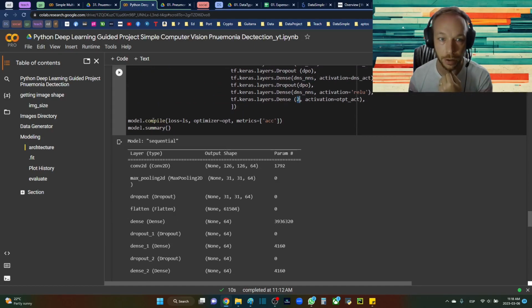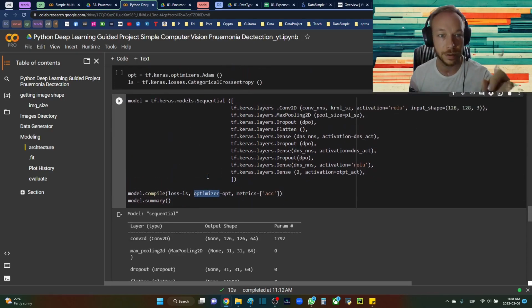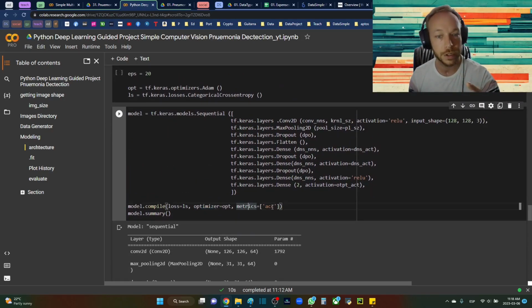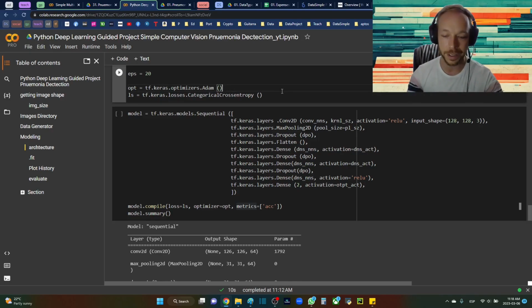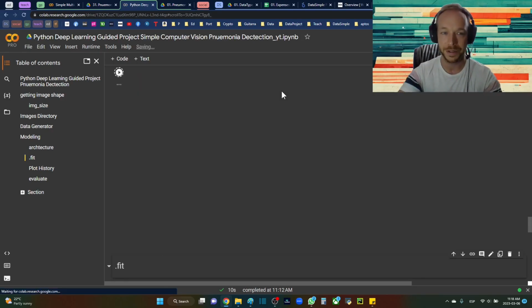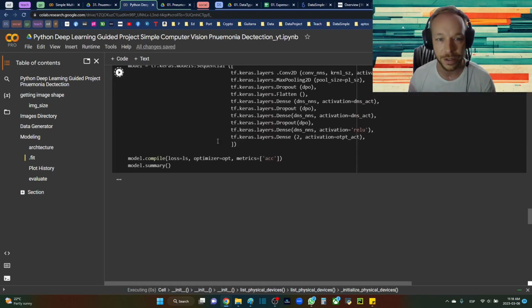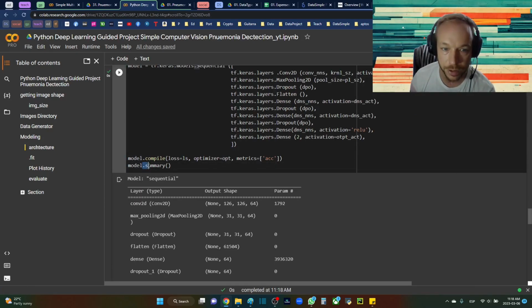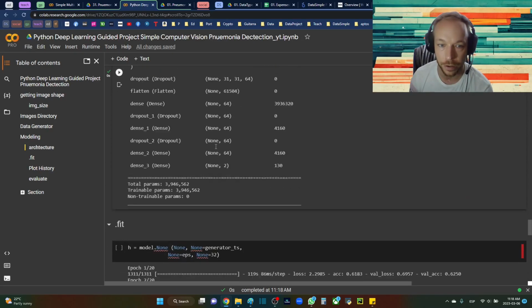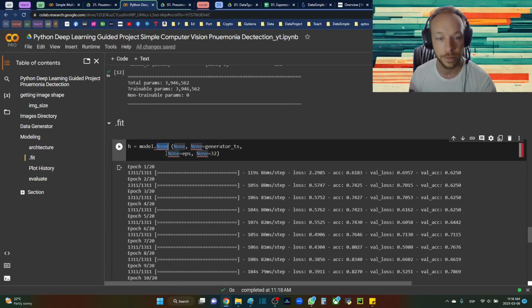We're going to compile our model. So loss equals the loss up above, optimizer equals the optimizer above. Metrics are accuracy, because just seeing the categorical cross entropy, it's not super understandable. It's just a number, really, truthfully. So we're just making sure we look at our metrics. Then just going model.summary to get a look at our neurons. Okay, so then we'll fit the model.